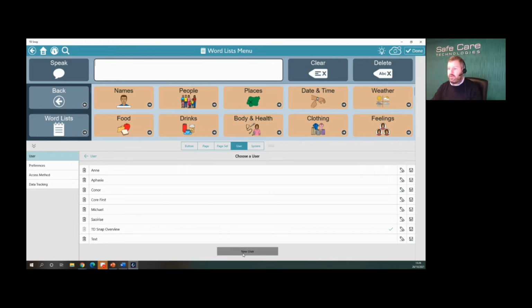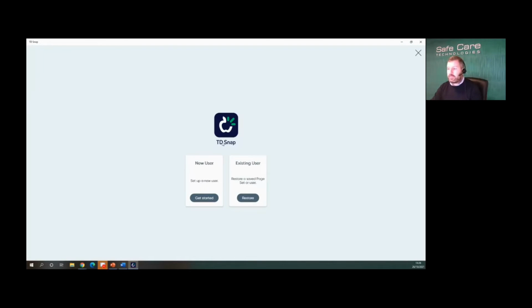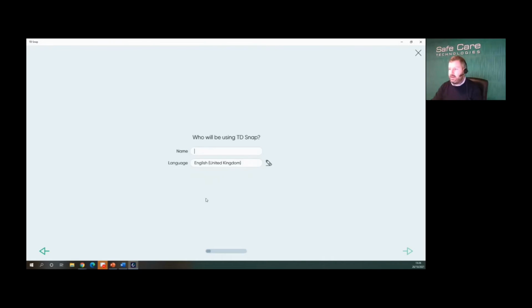So if I set up a new user, this is what it looks like. If I download the software for the first time and I'm getting started with somebody, I click Get Started. It'll ask who's going to do it. So I'm going to say I'm working with Ashita today. I'm going to click over.